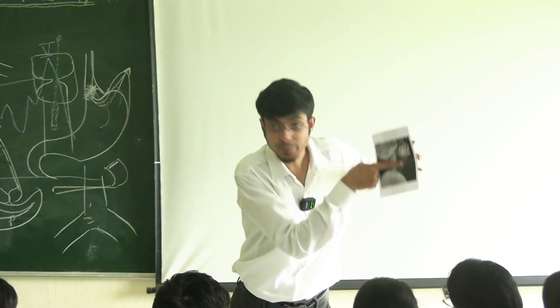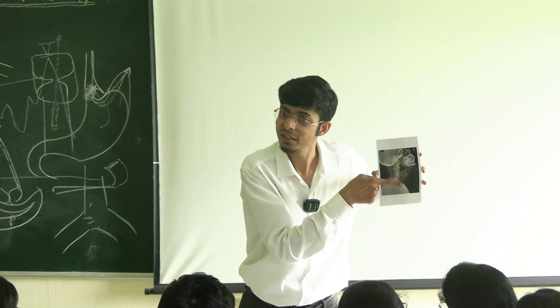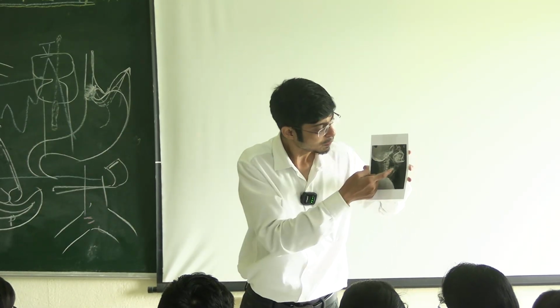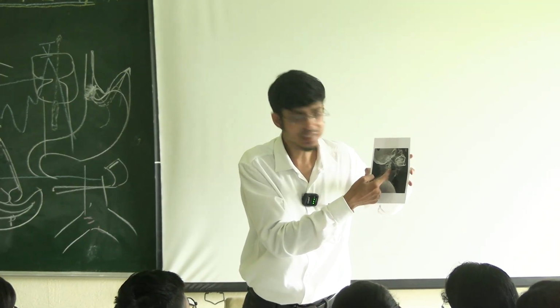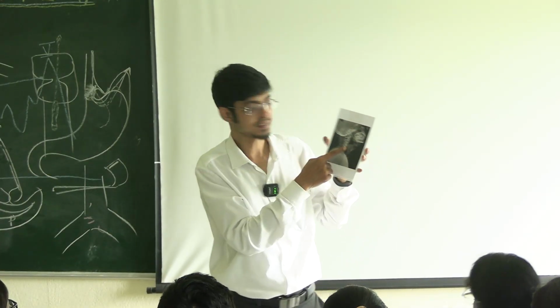So you can see the airway. Can everyone see the trachea? For the people on this side, you can see the trachea in front. So the trachea there is absolutely normal, nothing in there. So nothing related to the airway. Behind the trachea, what is there? The esophagus and the posterior pharyngeal wall. So behind that there is collection of fluids or pus. How do we know?